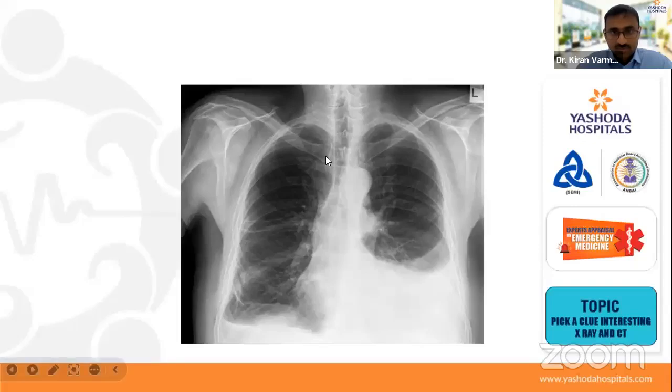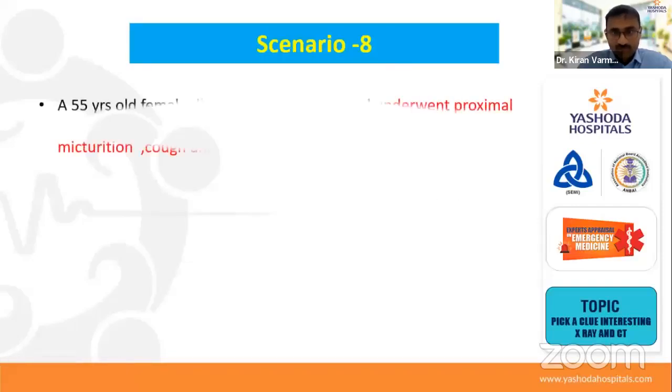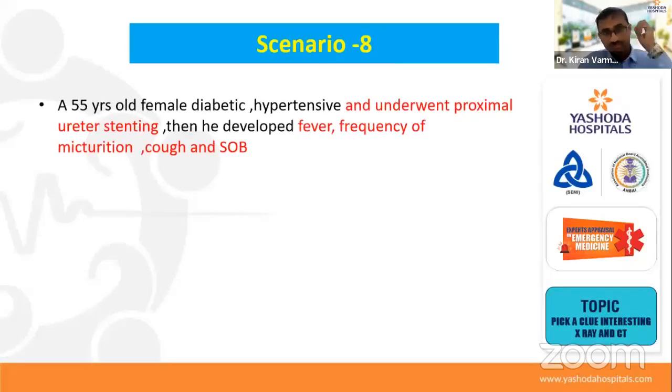So any other inputs from your side? So what about trachea? Okay, good. Now we'll move on to scenario 8.